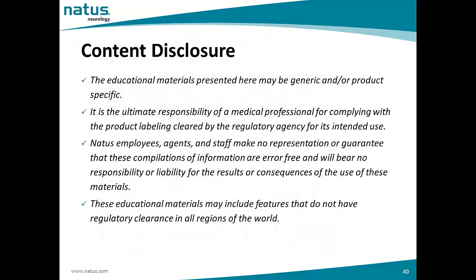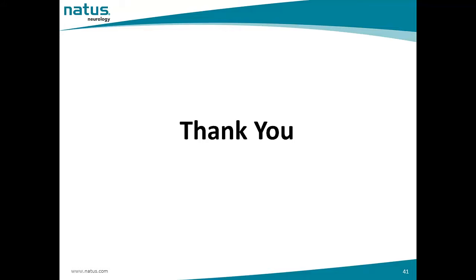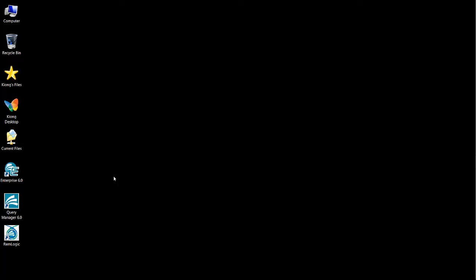Okay, now we will move on to the demonstration of the enterprise software. We will start with the enterprise software demonstration now.